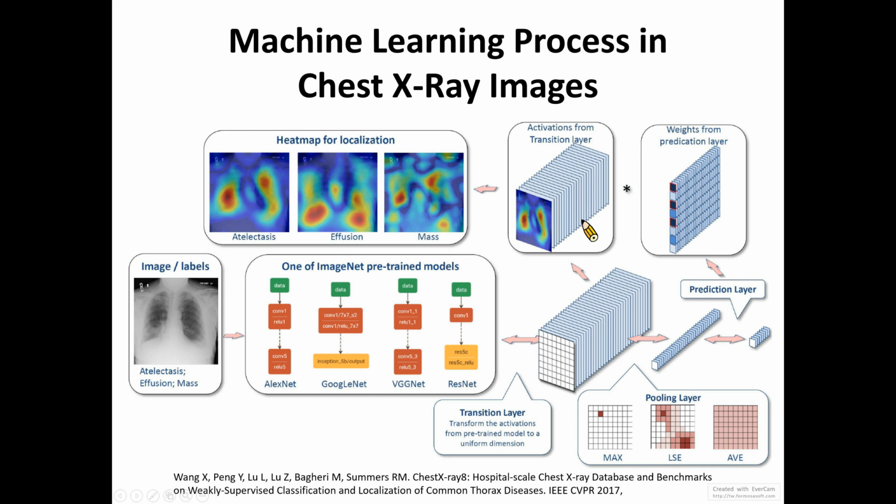The n minus 3 means that we extract layers from 1 to the layer excluding the last 3 layers. So I just copy this into MATLAB and paste it, assigning the layers to layersTransfer.